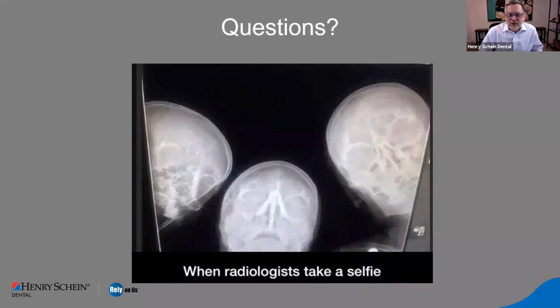Okay. And again from Dennis, the submental artery may be found directly on the medial fossa of the mandible with age and edentulous. CBCT is extremely important to prevent a lingual perforation and laceration of the submental artery. Does the submandibular gland cause the fossa to deepen?